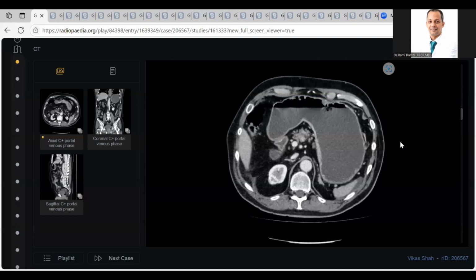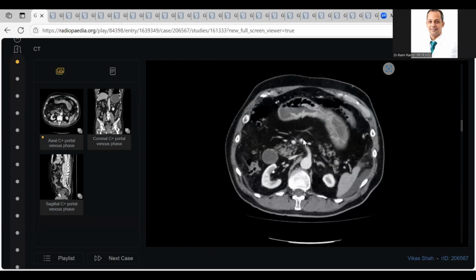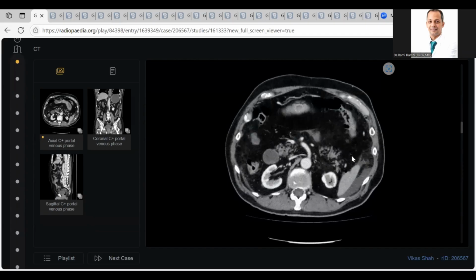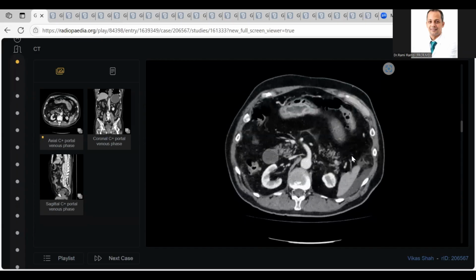And I can see that there is suspicion of... What is this? Tell me. So it's an enhancing lesion, I guess. Excellent. One enhancing lesion. So here, look, what is this? So the thickening and perforation, so bowel wall thickening. This one also. It is a very difficult case, by the way. Another difficult case.